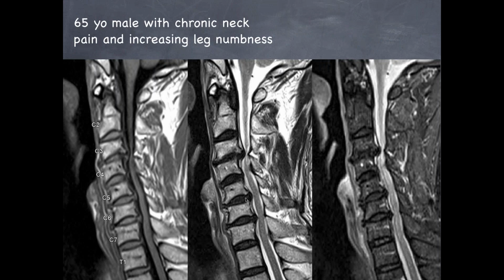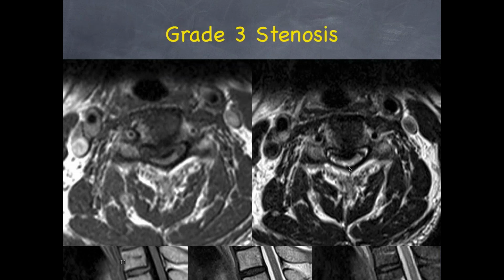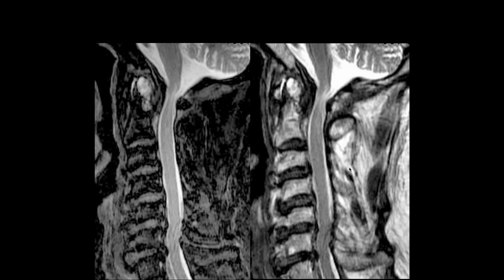Grade the stenosis. Looks like C3-4 grade 4 stenosis. Well, it's only grade 3 was the highest. I think there's a pretty significant signal there. Yeah, and there is abnormal signal, so that would be a grade 3 stenosis. Okay. Ahmed?